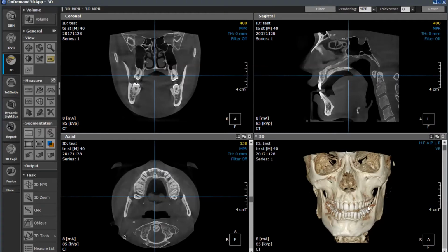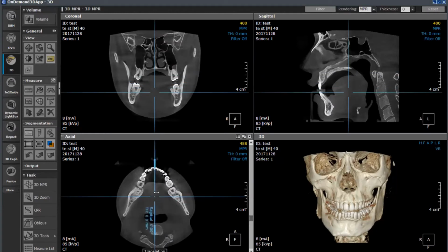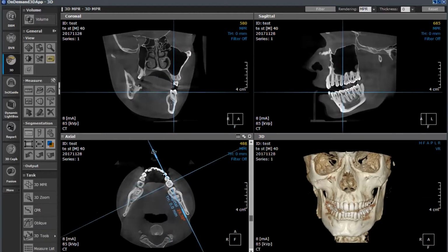There we go. With that in mind, we can start making a general evaluation of the patient. Let's go down to the mandible, and we can start moving our circle over to the left side, and then tilt it so we can create that tangential view that basically spreads it out to where we can see essentially a buccolingual view in the top right-hand corner in the sagittal.